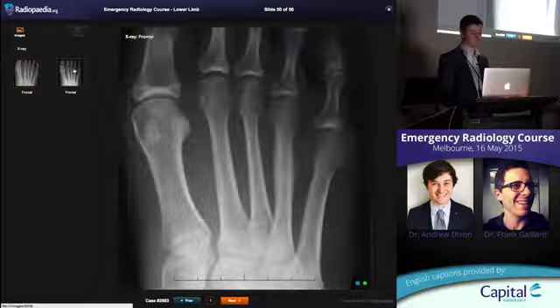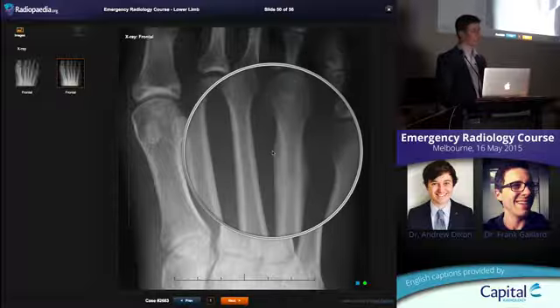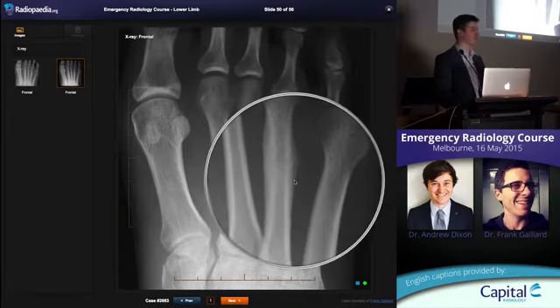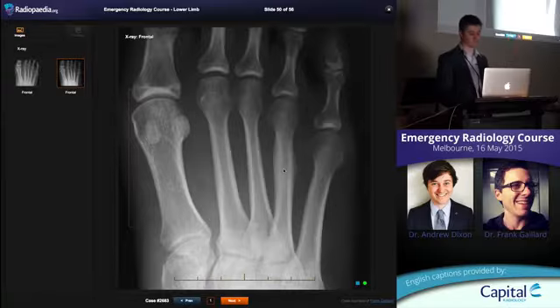If you get a film later on, once they've rested, stopped running because they run too much, have a rest, you'll see that periosteal bone is still thickened. It's always going to be thickened, but it's nicely remodeled, very, very smooth. Okay, so that's a chronic, benign periosteal reaction there. That means that it's all healed up. So fluffy is the active periosteal reaction.